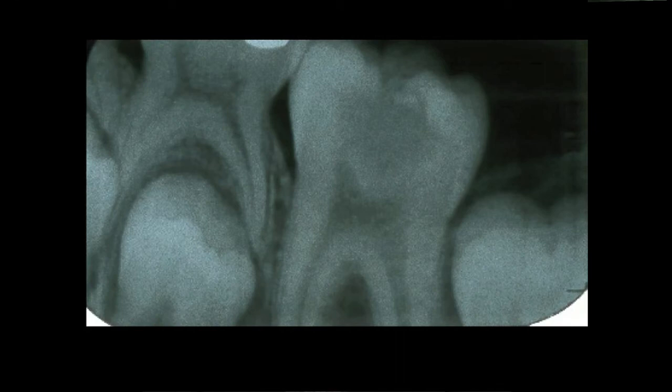Here is a bite wing x-ray which shows clearly the cavity in this lower molar, which is going to expose the pulp. However, this is not adequate to do endodontic treatment to go in and expose the pulp on this tooth. You must have a clear image of the roots to see the root development and what's around the end.